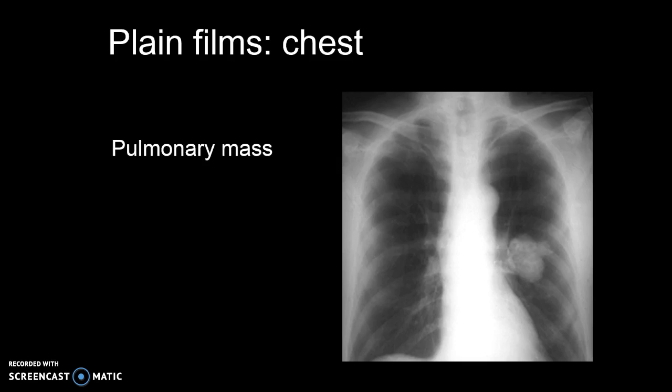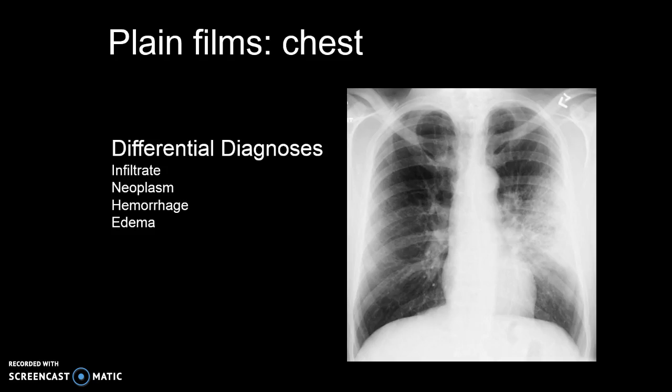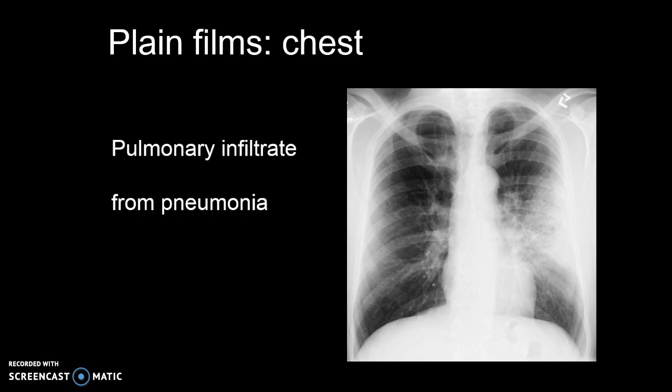This is a pulmonary mass, which is an area of pulmonary opacities that measure more than 30 millimeters. The common cause for a pulmonary mass is lung cancer. We see the hyperdensity region on the left side again. The term pulmonary infiltrate is considered a nonspecific and imprecise descriptive word. The term infiltrate refers to an abnormal substance that accumulates gradually within cells or body tissues. So this could be fluid, infection, or other things.